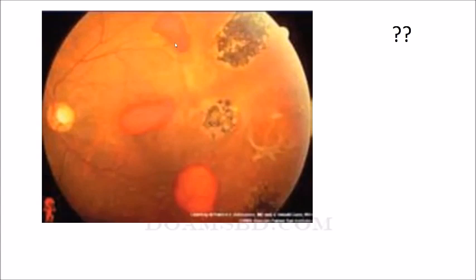But there is a damaged retina. It seems that it will consecutively involve the optic disc later. Then we will call it consecutive optic atrophy. But here the appearance of this type of blackening is called sunburst retina. So these are sunburst retina, and there are some others. It may be the acute stage of the retina. It is called salmon spot. So what could be the diagnosis? Can anyone say?